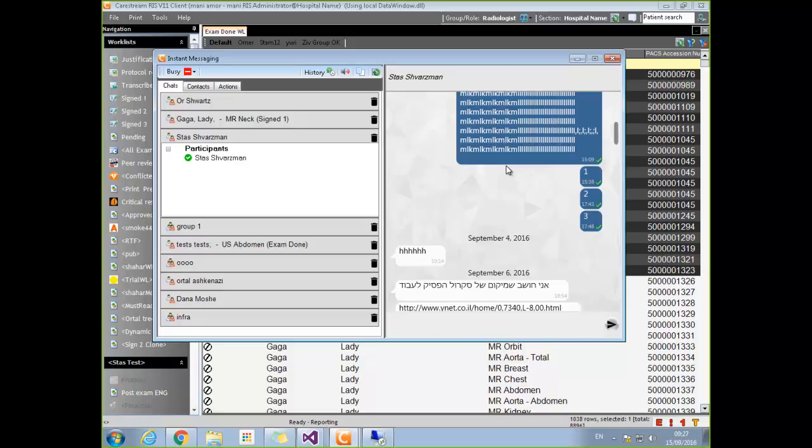PAX is going to use this chat, but the screen sharing feature is inside PAX. Let's say I'm in PAX, seeing a study. I can generate a session number, and the other PAX client can put this in and see the same screen. We showed it in the last service.